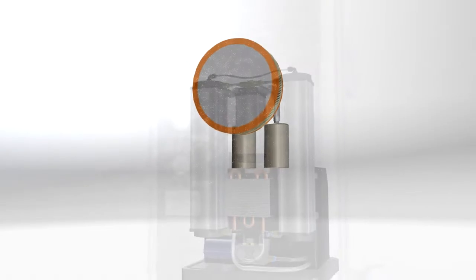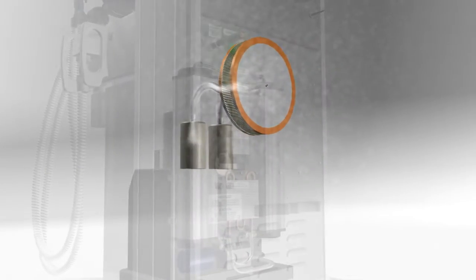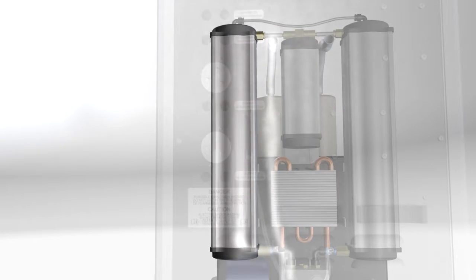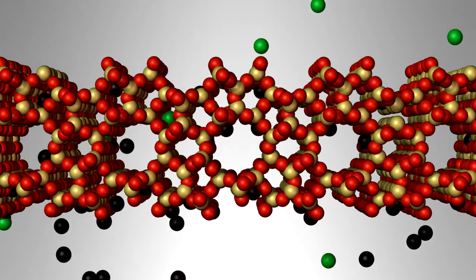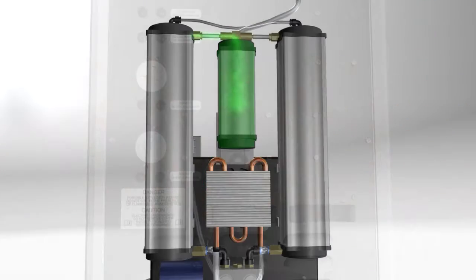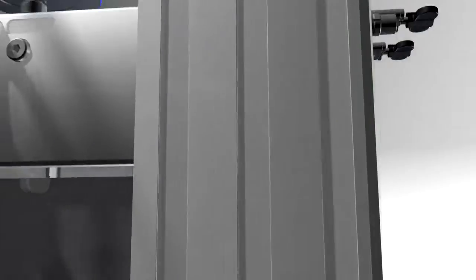Air is drawn into the UAM and is purified by two different filters. The compressed air passes into a canister filled with a powdered material called zeolite. Nitrogen sticks to the zeolite while oxygen and other gases flow through it to a reservoir tank. The UAM produces up to 10 liters per minute of oxygen.